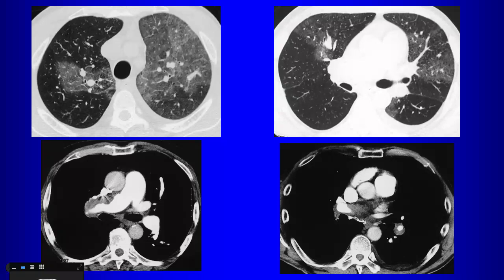It means that you have areas of increased opacity mixed with areas of decreased opacity. So if we had ground glass consolidations from pneumocystis pneumonia, that's also mosaic attenuation. But in that case, the ground glass areas are the abnormal areas. When you have mosaic perfusion, it's the lucent areas that are the abnormal areas.